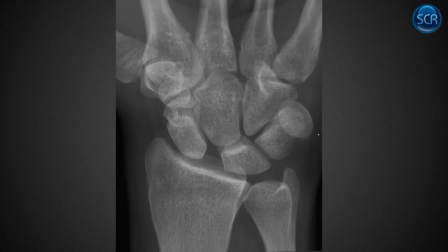This one is showing a very commonly missed finding in wrist trauma, which is a widening of the scapholunate joint. So they tore their scapholunate ligament. And that may not seem like a big deal, but that capitate's going to drop in there and cause a SLAC wrist, which stands for scapholunate advanced collapse. And so the collapse is this thing falling in, and that just wreaks havoc on the biomechanics of the wrist, precipitates severe degenerative disease. So you don't want to miss this.